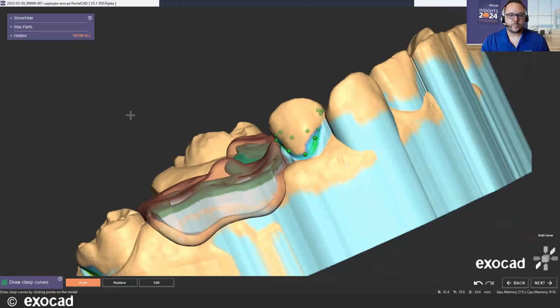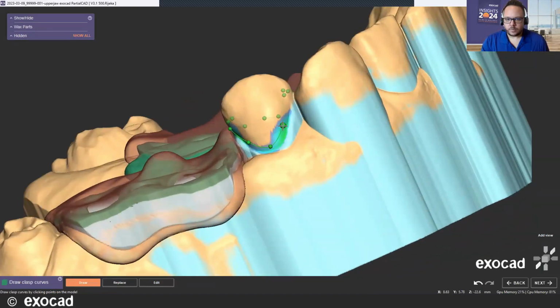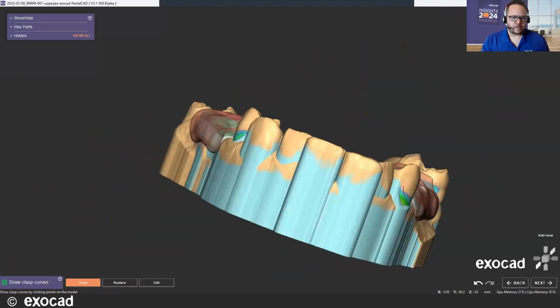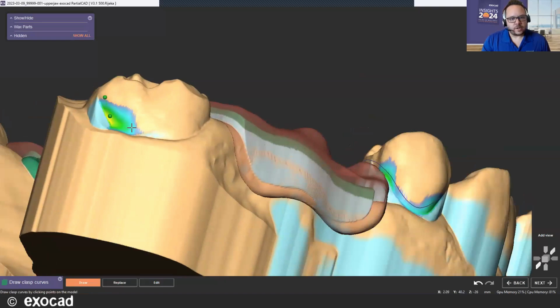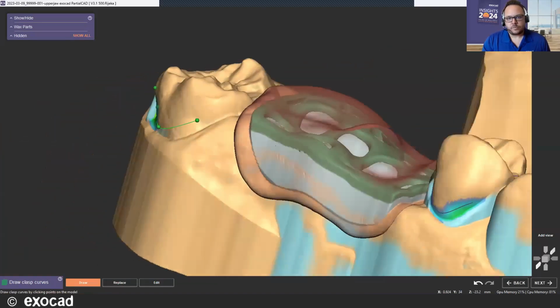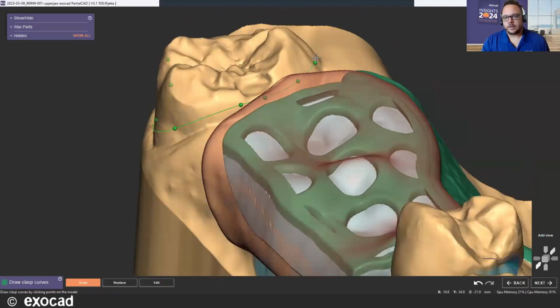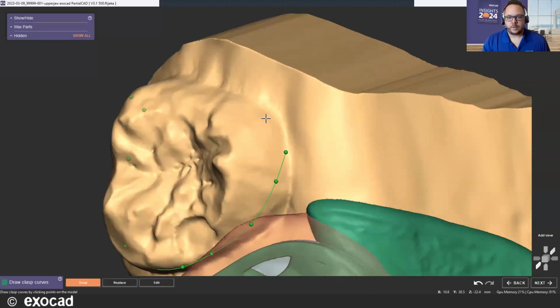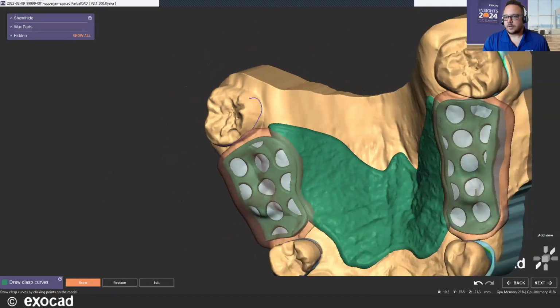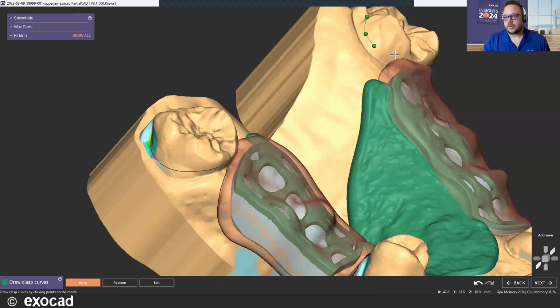Adjust that a little bit. Okay. There we go. I was clicking on my dot by accident there. All right, so our next clasp, go ahead and add in, and our final one.